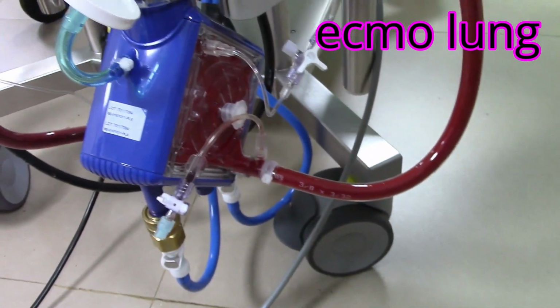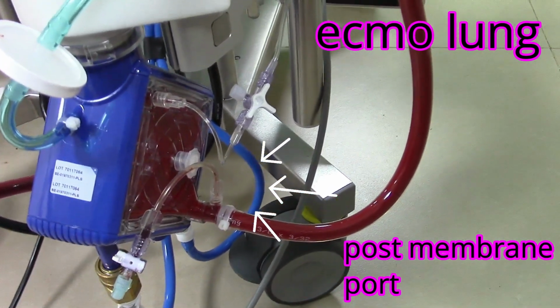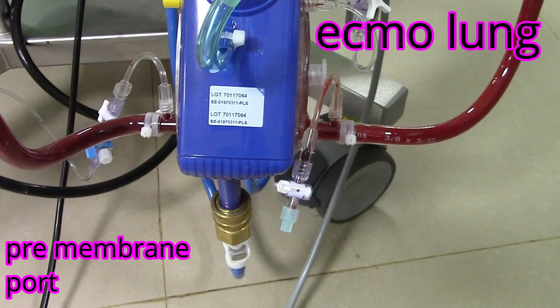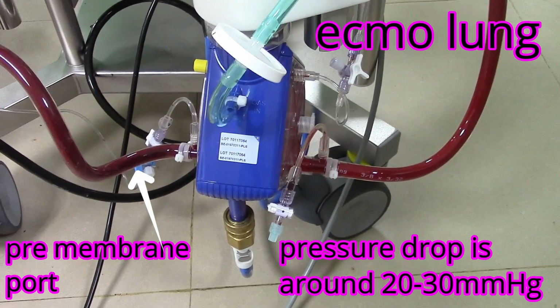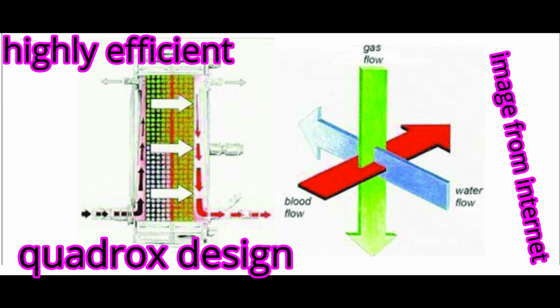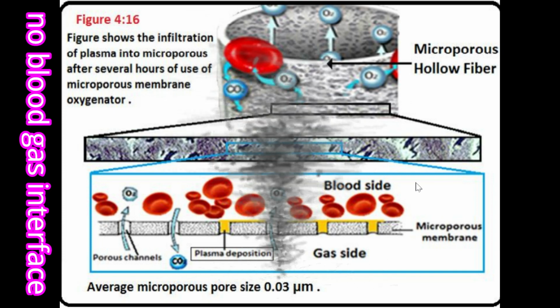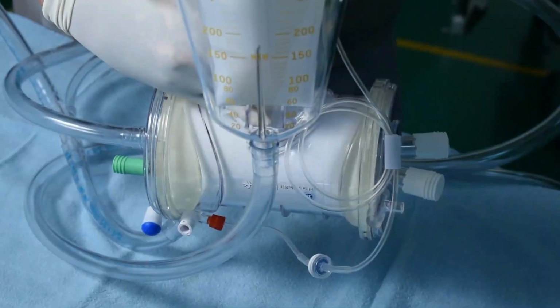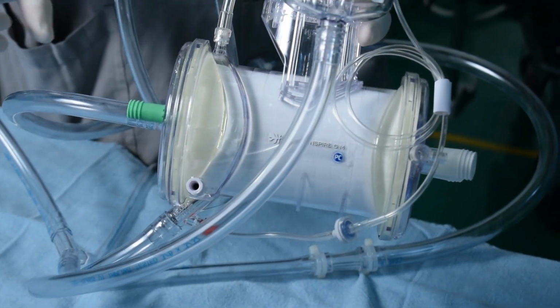Now, coming to true membrane lungs, they are the ones which provide a complete barrier between the gas and blood phases, so that gas transfer depends totally on diffusion of gas through the membrane material. They are expensive and have a large priming volume and are approved for long-term support, such as that seen in the ECMO. The important aspects of microporous membranous oxygenators are that there is an absence of direct blood-gas interface once the proteinaceous coating happens. It provides a high resistance to flow, therefore membrane oxygenators are always placed in front of the roller pump and blood has to be pumped actively across the oxygenator.